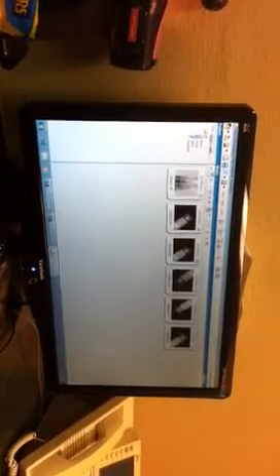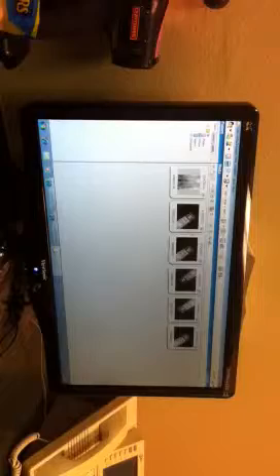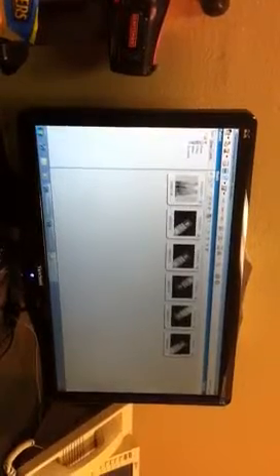In the patient record, you have several things you can do. Under the media bar right here, these buttons all affect the view of the thumbnails in the gallery. That's all they do, is the view of the thumbnails. So let's go ahead and show you what they do.